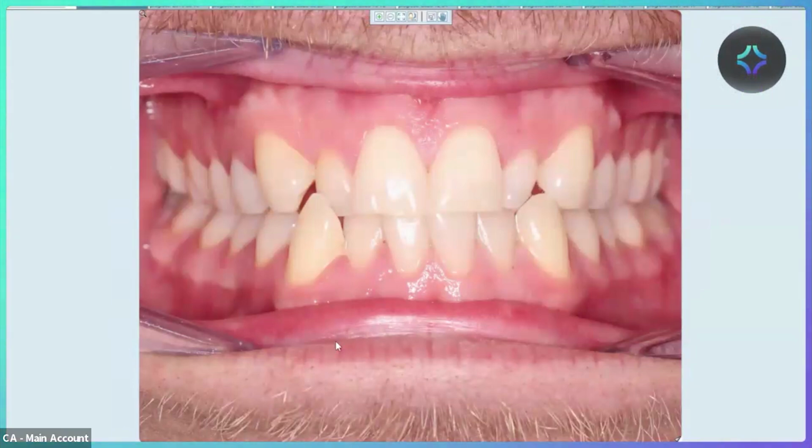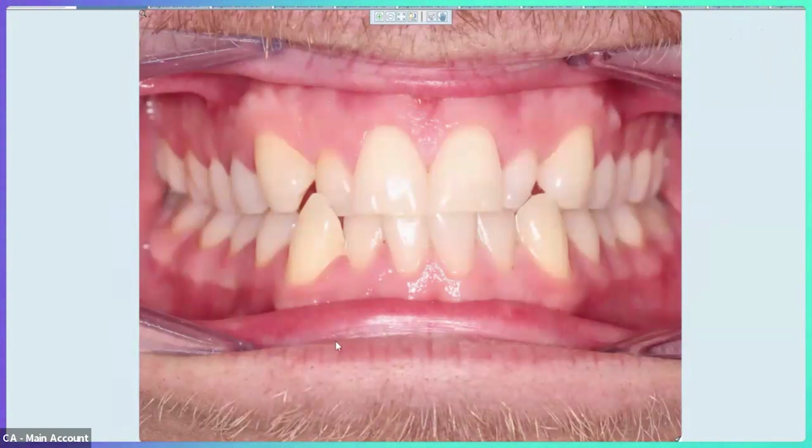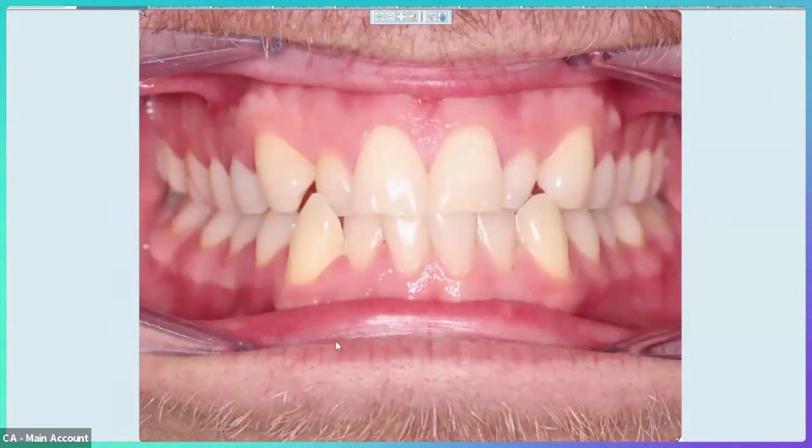And so in order for us to fix this, we can do some smoothing between your lower teeth to make them slightly smaller. But ultimately, when we look at this, your upper teeth need to actually get a bit bigger on the lateral incisors. Now, ideally, how we do that is we would like to plan a little bit of space behind those lateral incisors so that we can do a buildup.